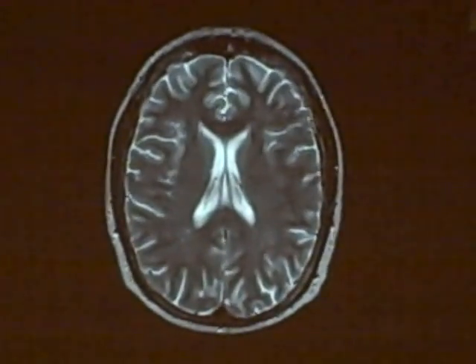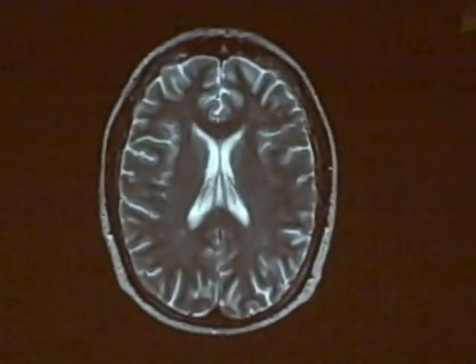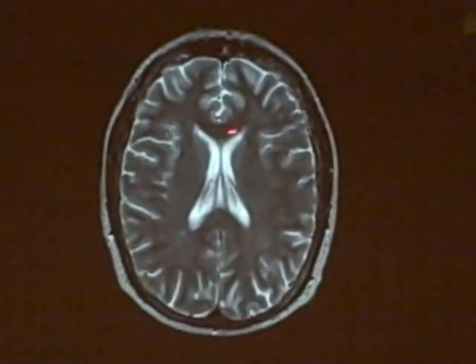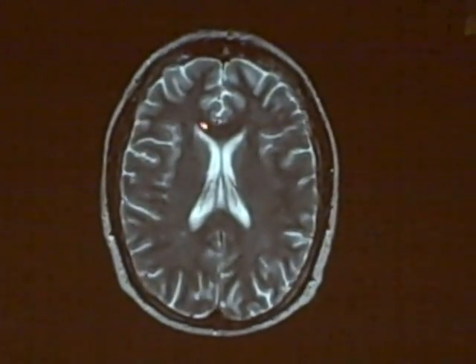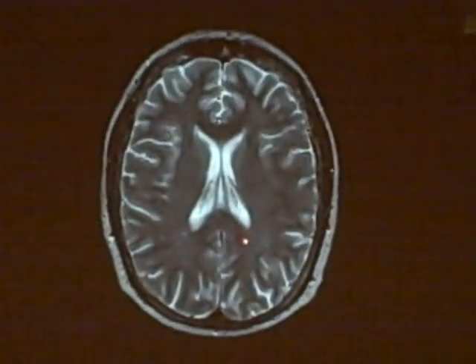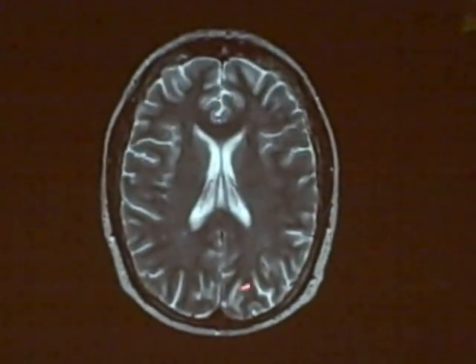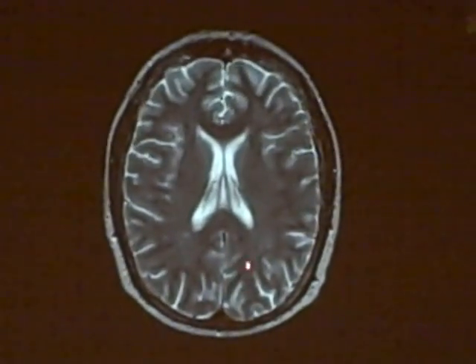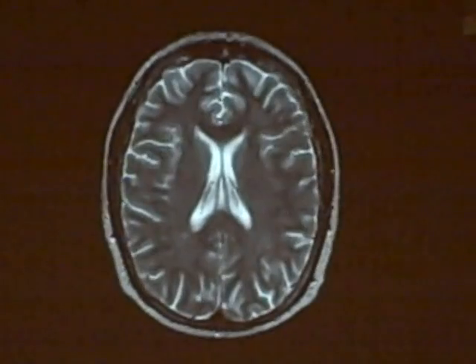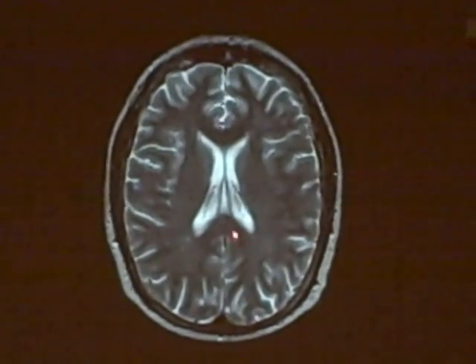As we get higher up, there just aren't a lot of pathways and structures to point out. Of course, we have the lateral ventricles, and we have the corpus callosum here, the genu and body, and then back here we have the splenium of the corpus callosum, which interconnects the occipital lobes. Hard for me not to tell you about what that does clinically because it's so interesting. But anyway, next year.